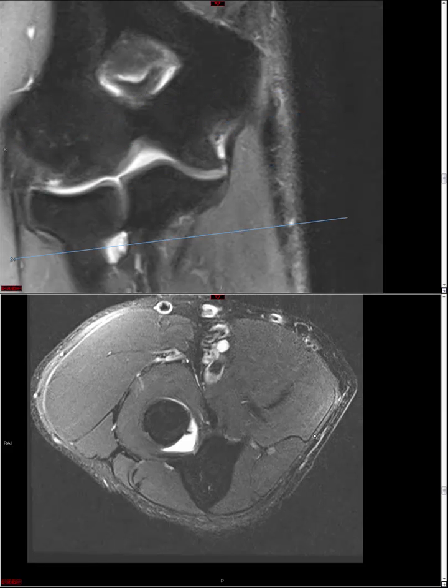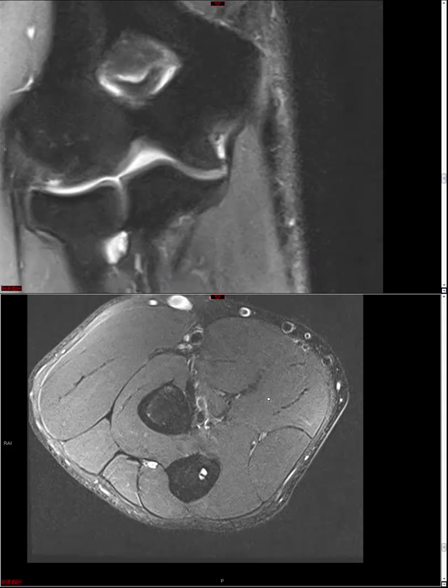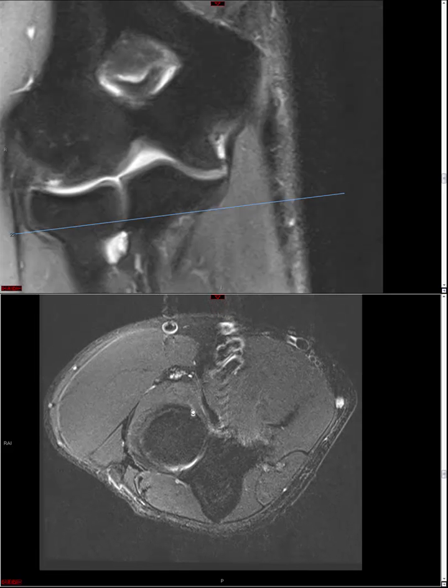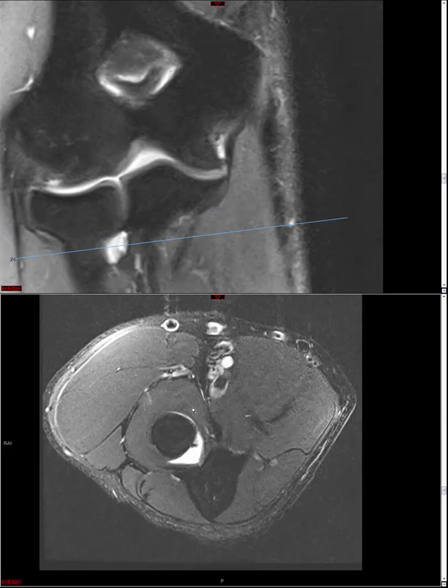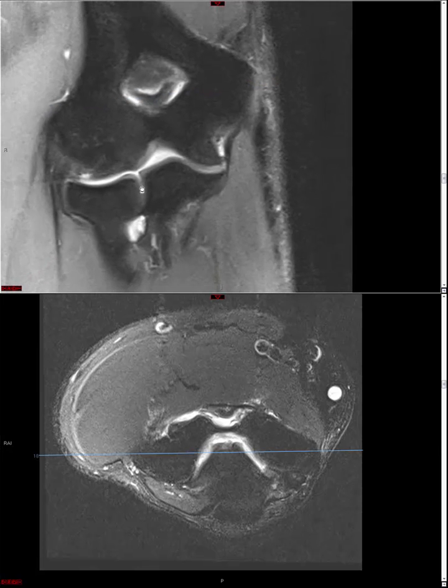Great. Later on in this tutorial, we'll talk briefly about some of these muscles. I don't think it's critical to know all the muscles, and usually if it's one of these other muscles that doesn't have a characteristic appearance like the supinator, then even I have to look up very quickly what muscle it is. But we'll talk about some key ones that might help you by serving as a landmark.